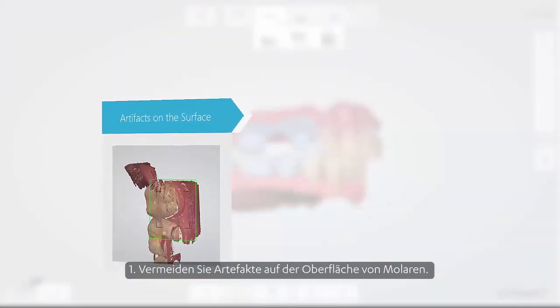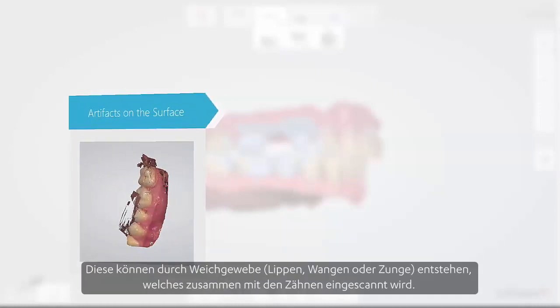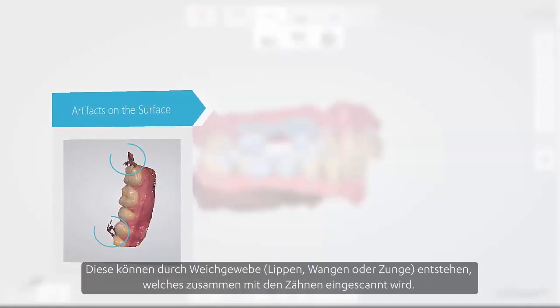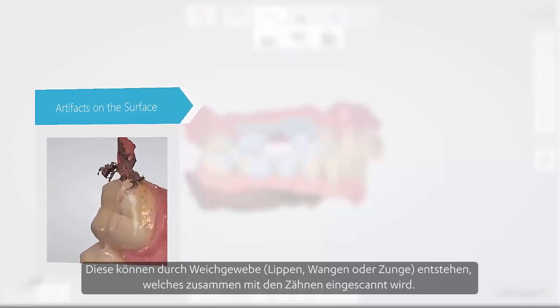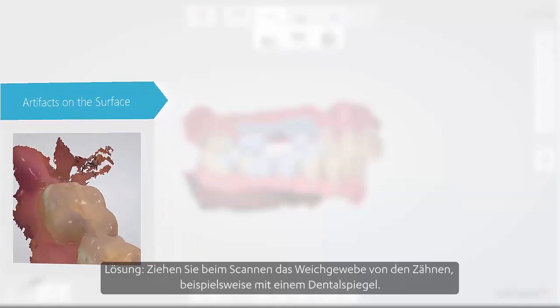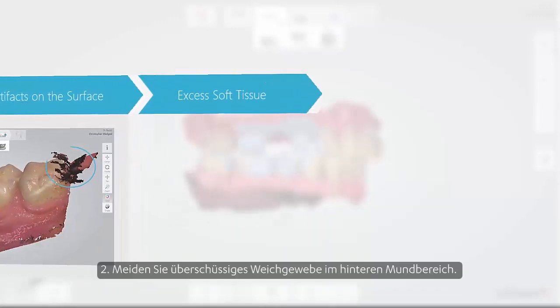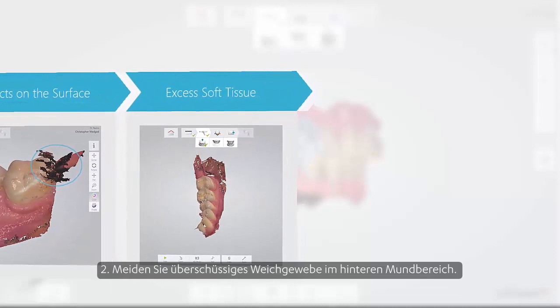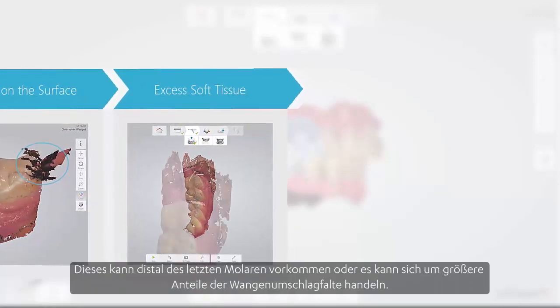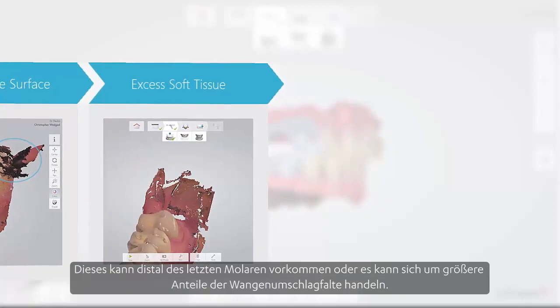1. Avoid artifacts on the molar surface. These may result from soft tissue, lips, cheek or tongue being scanned onto the teeth. Fix: retract soft tissue from teeth while scanning, using, for example, a dental mirror. 2. Avoid excess soft tissue at the back. This may be to the distal of the last molars, or it may be large portions of sulcus to the cheek.